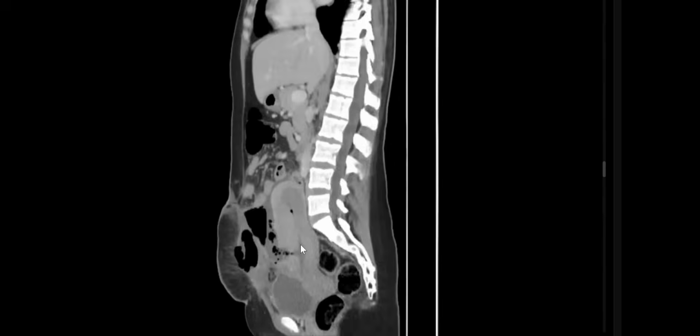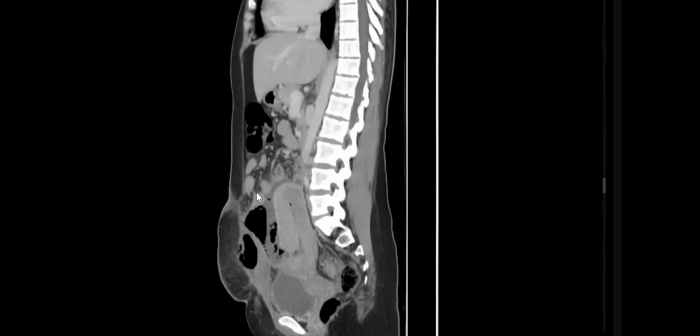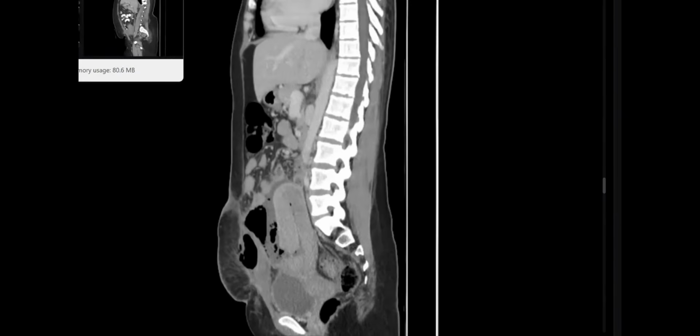Here, unlike the previous case, we have some evidence of endometritis and a defect with abscess formation. Through this defect, an abscess is formed. This is a uterine dehiscence with infection and abscess formation. It's not continuous with the peritoneal cavity, so no uterine perforation or diffuse peritonitis, and there is an associated abscess in the rectus as well. Very good, my friend.